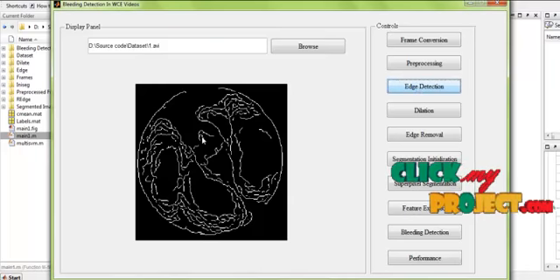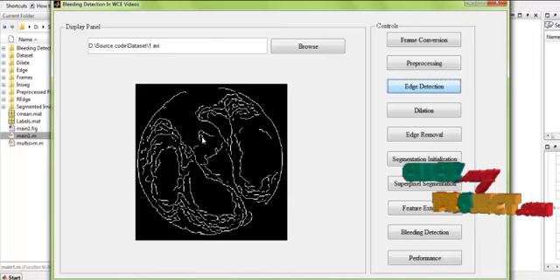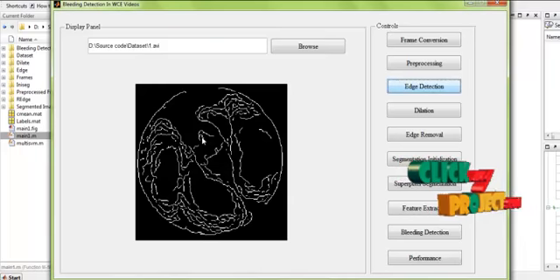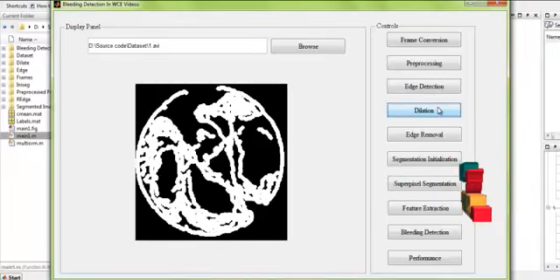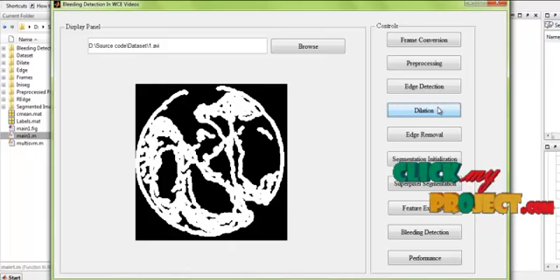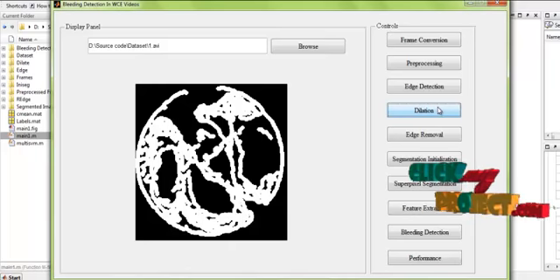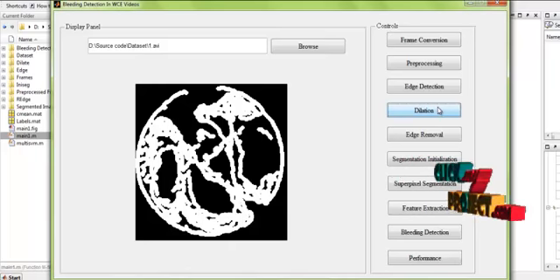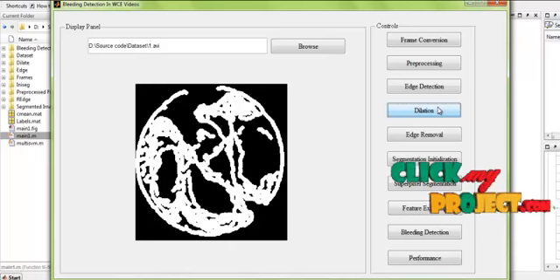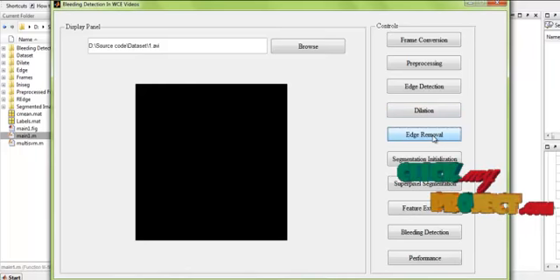In this process, the regions in the images that contain the overall edges of interest were identified. Based on this, for the further processes, the identified pixels were selected. Then the dilation process is employed. During dilation, the regions selected in the previous edge detection were well identified, and the overall identified regions were increased. This helps in searching the complete video frames for the detection of the portions in the video frames. After that, the edge removal process.